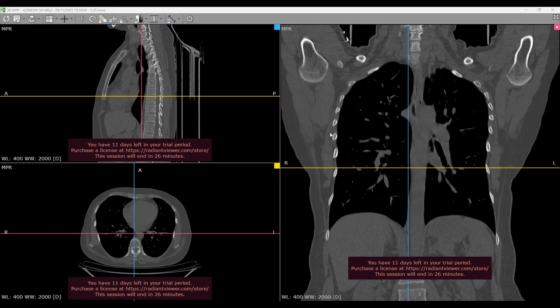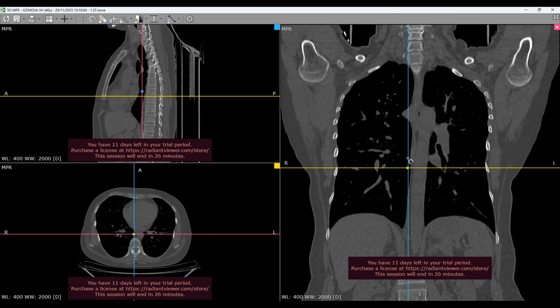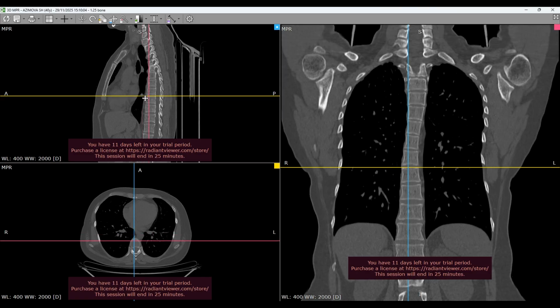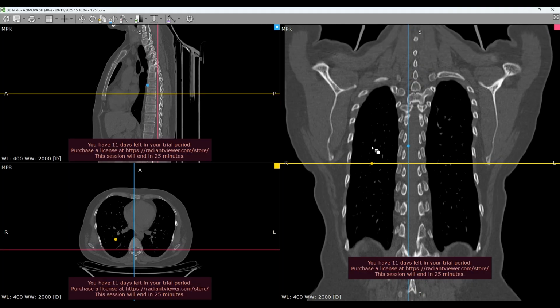The provided image is a coronal view from a chest computed tomography (CT) scan, showing the thoracic cavity and its major anatomical structures. In this view, both lungs appear prominently as dark regions due to the low density of air, which absorbs very few X-rays.